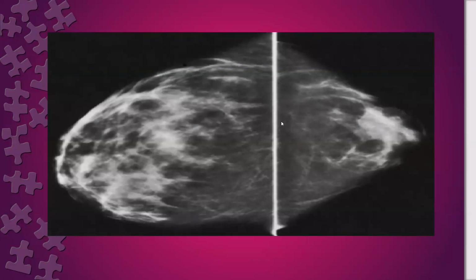So the left breast looks smaller, with small glandular tissue. Any associated suspicious feature, this is an important thing. Any abnormality, any masses, any distortion, any asymmetry, any calcification, any skin thickening? Can you see any associated abnormal findings apart from this asymmetry?